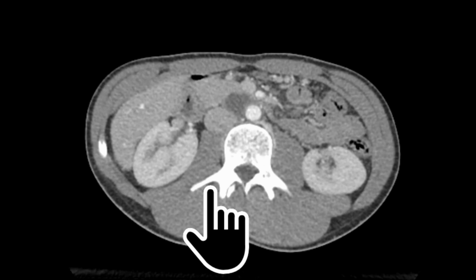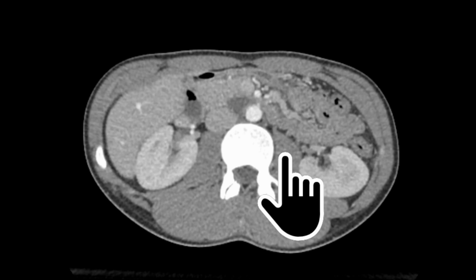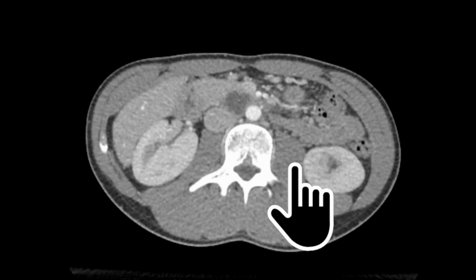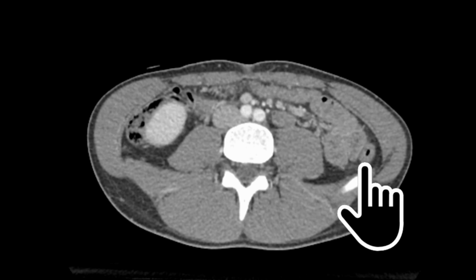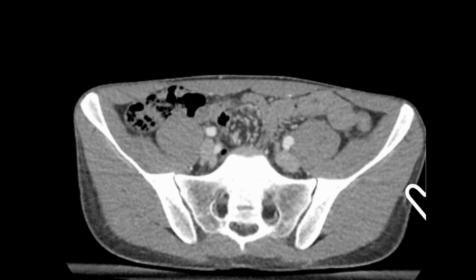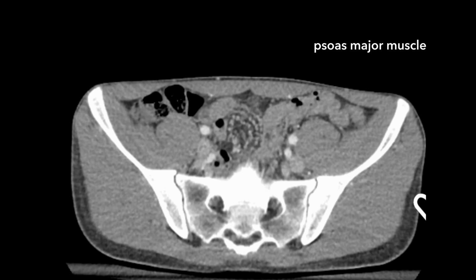But while we're looking around here, we've got the muscles of the back here, but we've got a couple of really cool muscles in here. So the kidneys lie lateral to, watch this muscle block as we scroll down. It's a really big chunk of muscle, isn't it? That is psoas major. That's going to run down to the lower limb and be one of the major hip flexors.